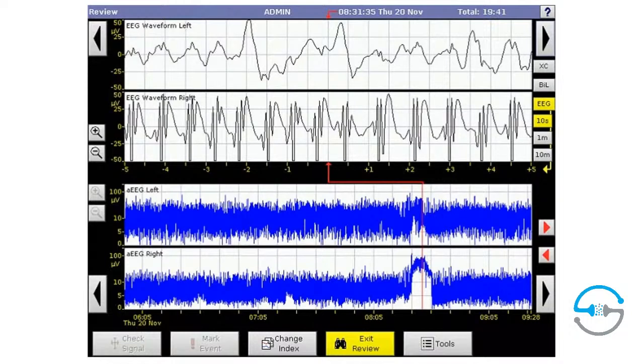And we're looking for the rhythmic pattern. So this particular monitor screenshot is 10 seconds. Each line up here representing one half of a second. So this is 5 seconds up to here, an additional 5 seconds. So depending on your screen length or the way you've set it, you may have 10 seconds or 15 seconds.